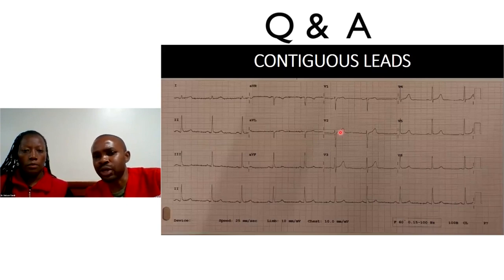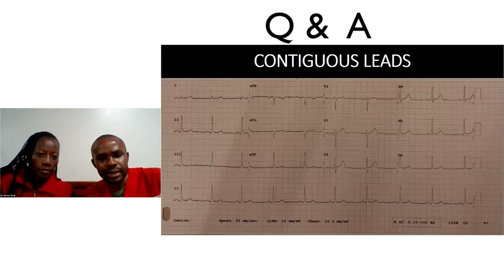Further to that, which I think we'll discuss in week 3, we're also talking about things to do with what we call the Wellens T waves, biphasic T waves. And all those are pathological. But for today, we are saying a T wave should be upward facing in the leads. And if it's downward facing, you're asking yourself, what's going on? Normally in the AVR, you would expect a downward facing T wave. Awesome. All right.